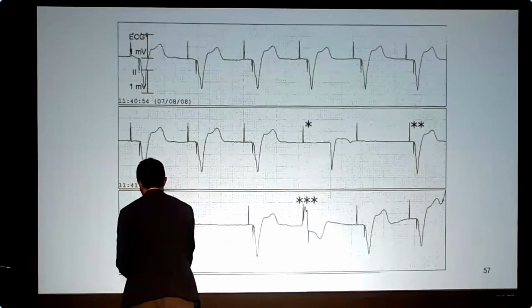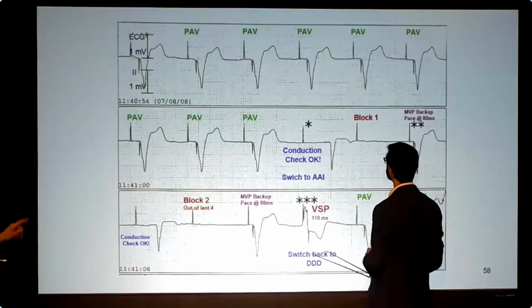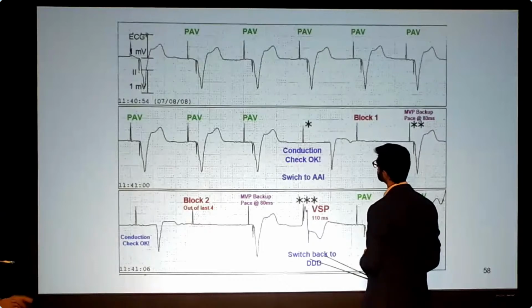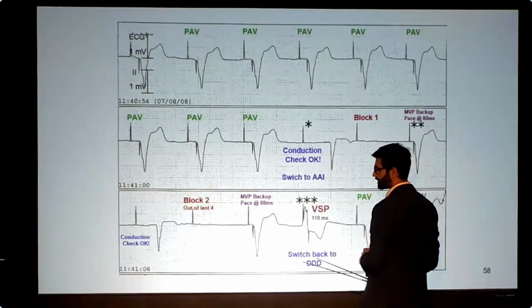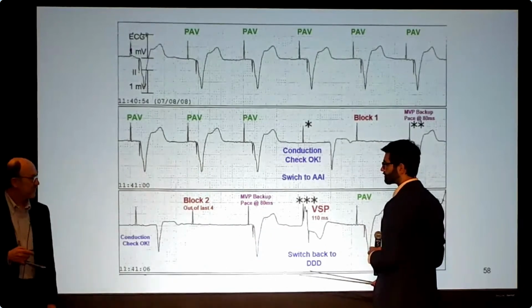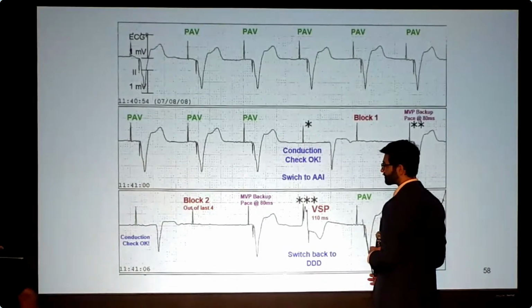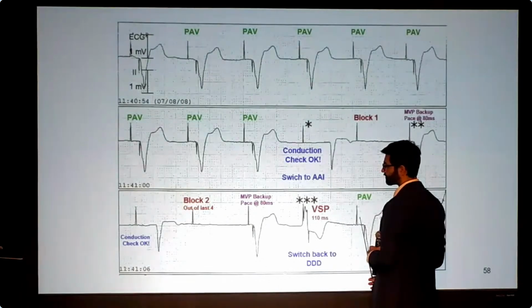Oh, it's shorter. I think this is AFib. Look at the baseline. I don't see any good solid P waves. Even the paced ones, it doesn't look like it's really captured. It's like flat. Look at the second one up there, the stimulus. The spikes are still the spikes. I just don't personally think there's, I mean, like I said, I may get murdered. I would have called this AFib. I just don't personally think you're capturing the atrium because I think the patient's got underlying fine AFib. The spikes still are the spikes and where they are for the reason they are, but I don't think you're capturing atrium, frankly.